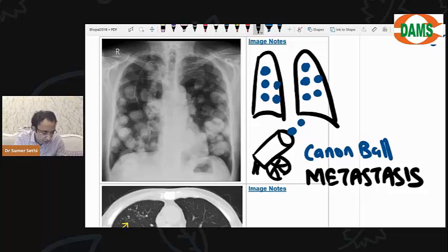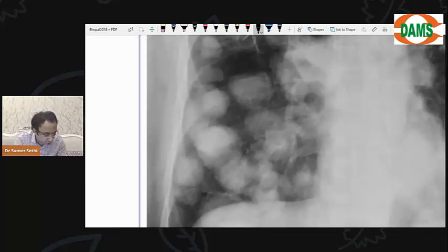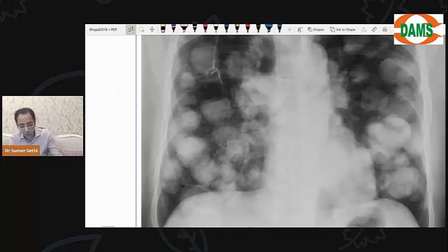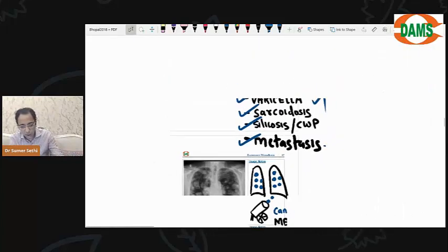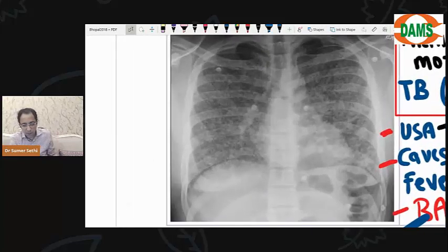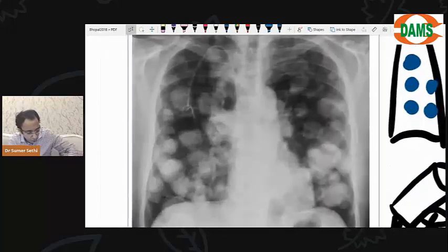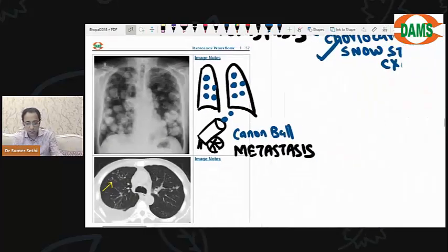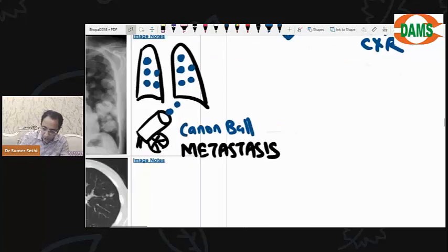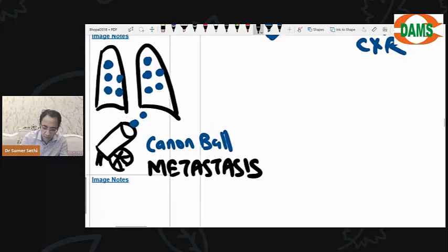So how will you differentiate, beta? Size है ना, देख ये cannonball बड़ी है, मक्के के दाने वाले छोटे थे. So we are able to differentiate. Are you clear? Okay, so both of them are hematogenous. That is why I am keeping them together. That TB, when it spreads via hematogenous route, looks like miliary appearance, millet seeds, while cancer, when it spreads via hematogenous route, looks like cannonball. So this is typical cannonball appearance seen in lung metastasis. Okay, now initially it was described for RCC, but now we believe that all cancers can have this appearance.